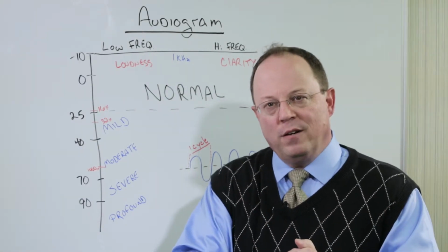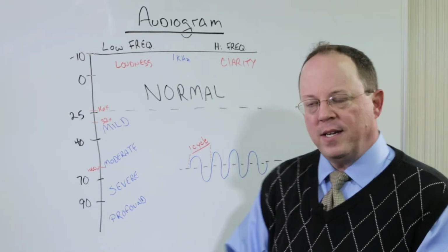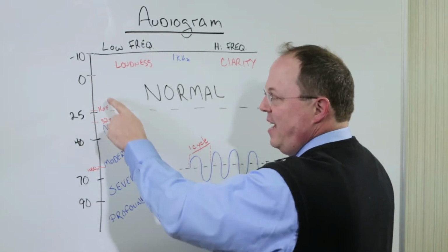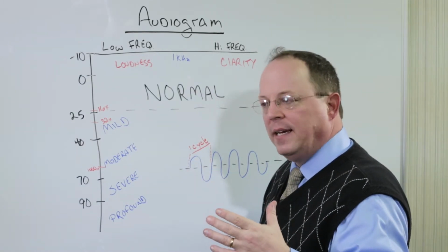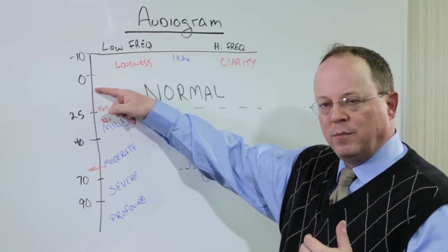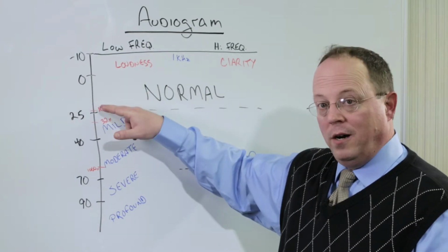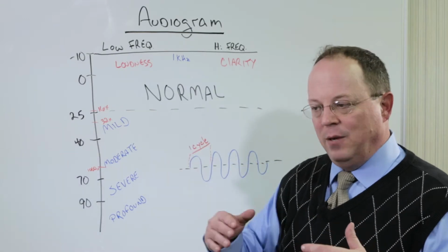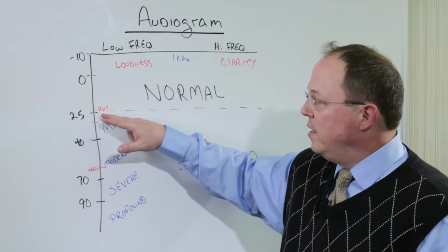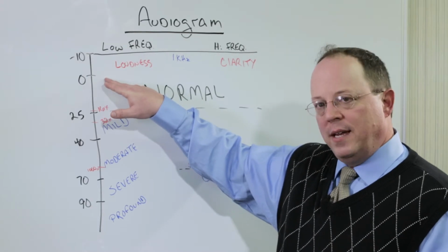And so everybody, when we get into our 40s, but at least by our 40s, we start to have a hearing loss. It's just part of the natural aging process. And so your hearing will start to decline. But this scale, it's a logarithmic scale, meaning that every time you decrease or increase the volume by 6 decibels, you're doubling the volume. And so 6 will be twice as loud as 0. 12 will be twice as loud as 6. It will double again at 18, and then it'll double again at 24. So if you think about this, 24 is 16 times louder than it was at 0.